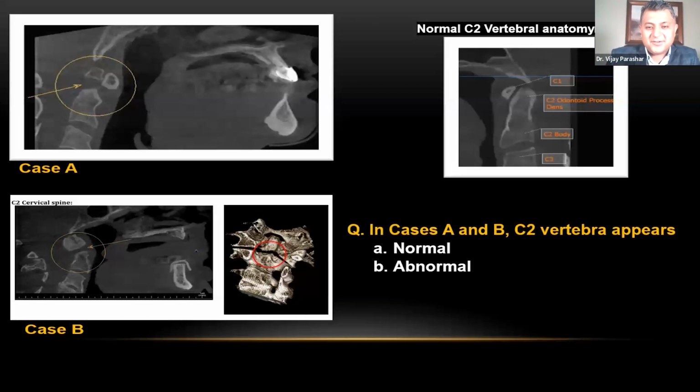You're awesome. Thank you. So yes, it is abnormal. So what's going on? What do we do with it? Even though we were looking at airway and these structures are just adjacent to it, you might catch it when you're doing your airway evaluation. And that is why I'm bringing it here today.